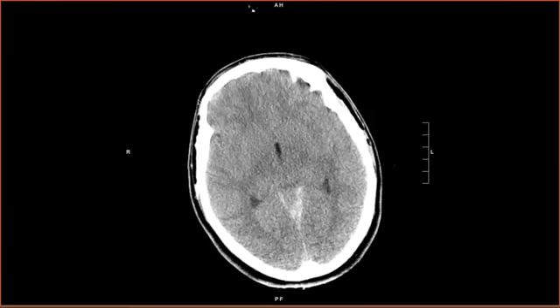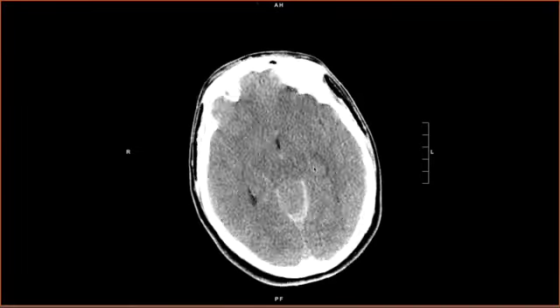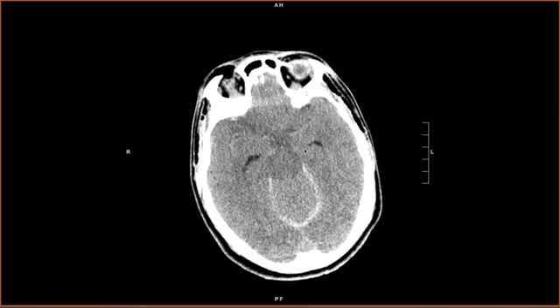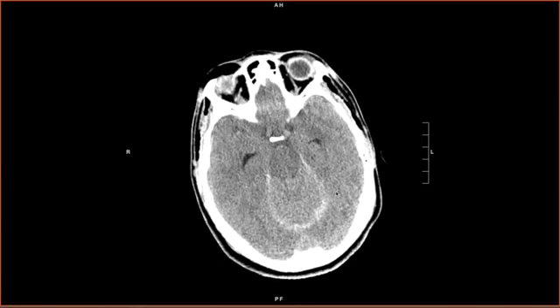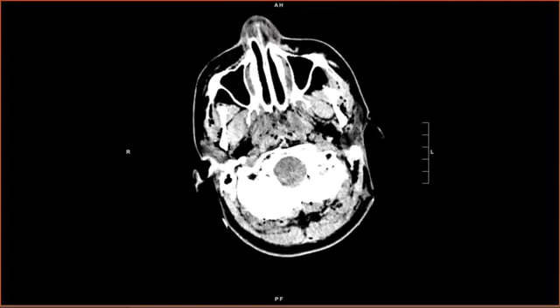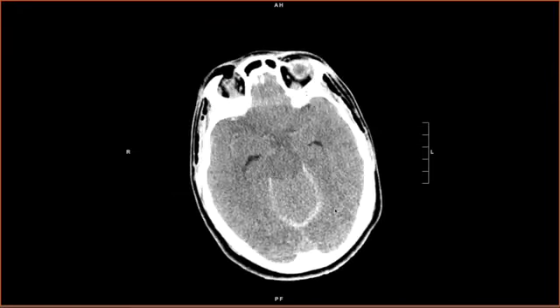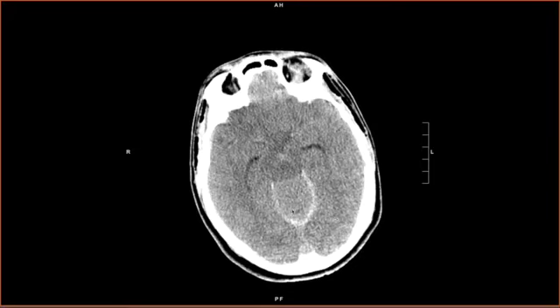The reason is because this brain is edematous, causing diffuse sulcal effacement and obliteration of the suprasellar cistern. As I scroll more inferiorly, still looking for mass effect, there is fullness at the foramen magnum, suggesting tonsillar herniation. Okay, as a bonus point here, there's also ascending transtentorial herniation. The infratentorial brain is herniating superiorly through the tent and causing effacement of the quadrigeminal cistern here.